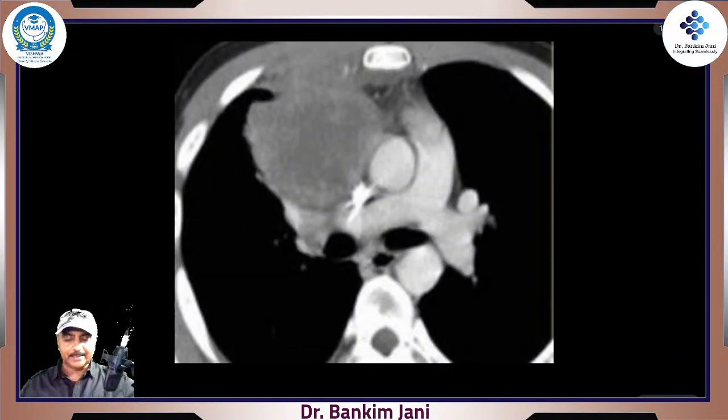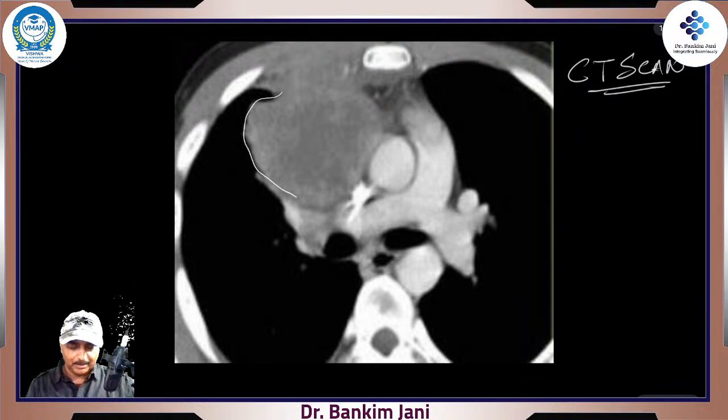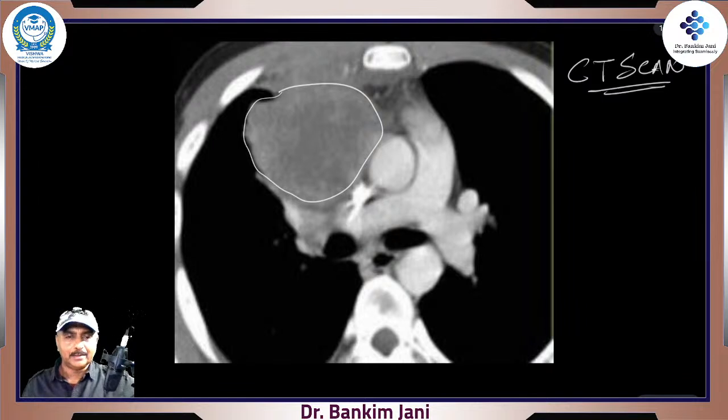We go for CT scan, right? So that's the CT scan. And the moment you do the CT scan, such a big mass, and that's the mass, right? Where is the hilum? Here is the hilum. Here is the hilum, right? Got it? This is the hilum. And this mass is superimposed.